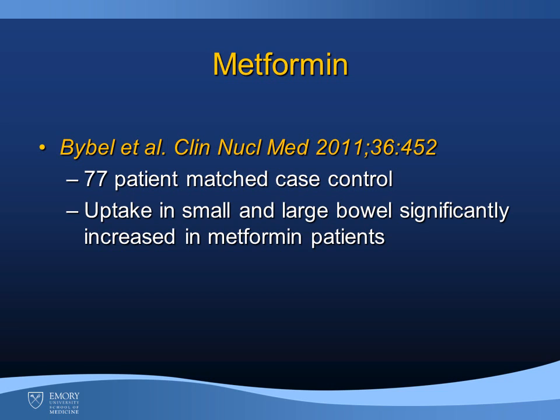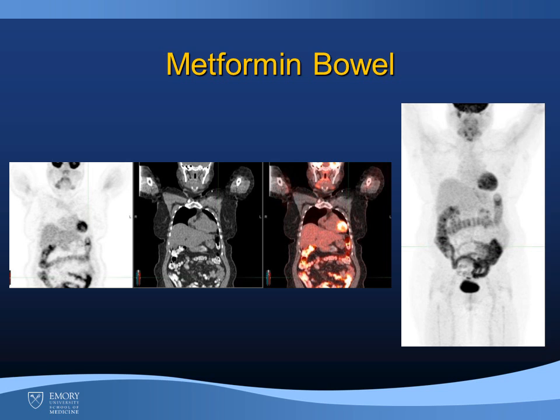Metformin can cause increased uptake throughout the bowel, in both large and small bowel. And this is a characteristic appearance of metformin bowel. And many times, if you have this appearance and the bowel looks otherwise normal, and you look at the medication record in the electronic medical record, you'll see that metformin is being taken by the patient.